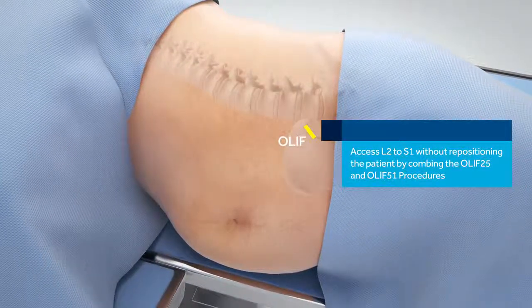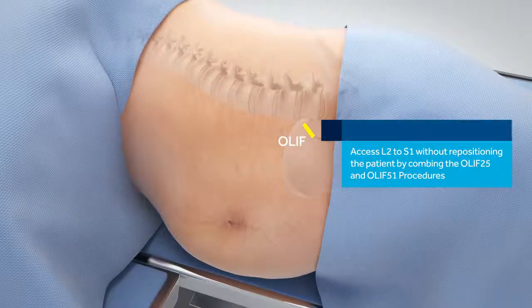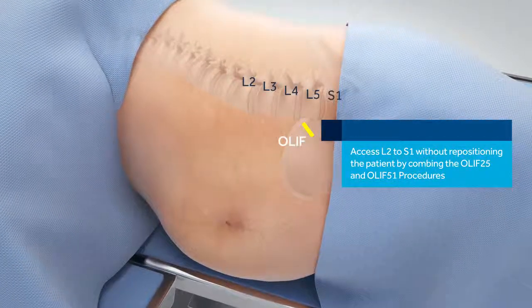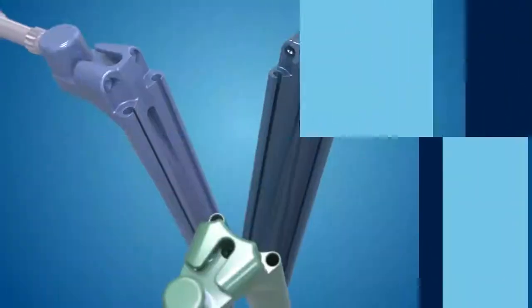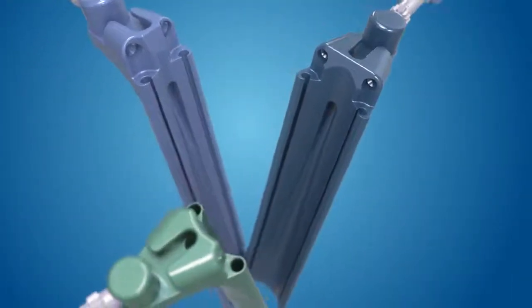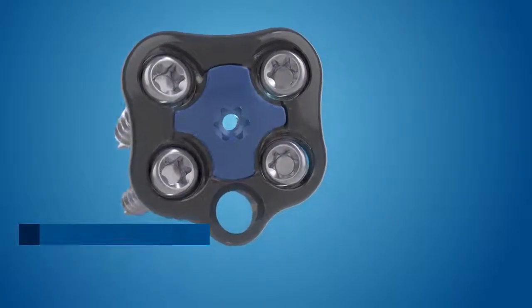In combination with the OLIF 2-5 procedure, OLIF 5-1 allows a surgeon to access levels from L2 to S1 with the patient in the lateral decubitus position. The OLIF 5-1 access system is a retractor system optimized for the OLIF 5-1 procedure.